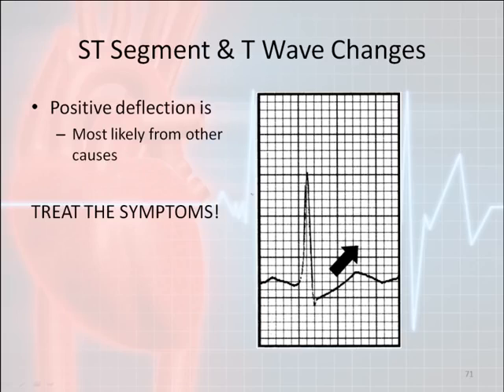The third type of ST segment depression is one that actually has a positive deflection. If you look at the J point right here, as it travels back up to baseline in this direction, this is most likely caused by other causes. Least indicative of subendocardial ischemia. In other words, if you see this, not very diagnostic. You can't use this at all.